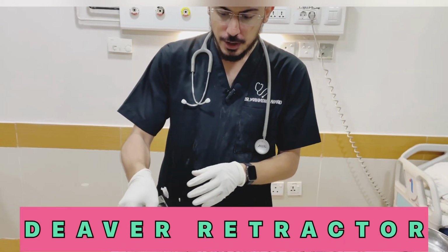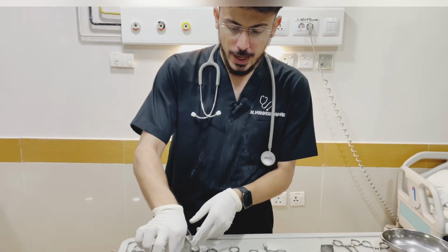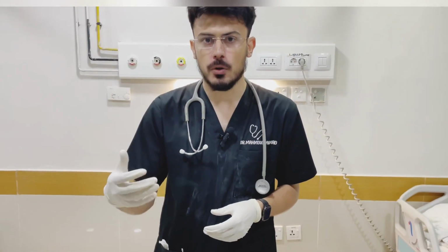And this is known as DEAVER retractor. These are the large DEAVER retractors. This is the medium size DEAVER retractor, and this is the small DEAVER retractor. Usually it is used to hold the abdominal wall and in abdominothoracic procedures.